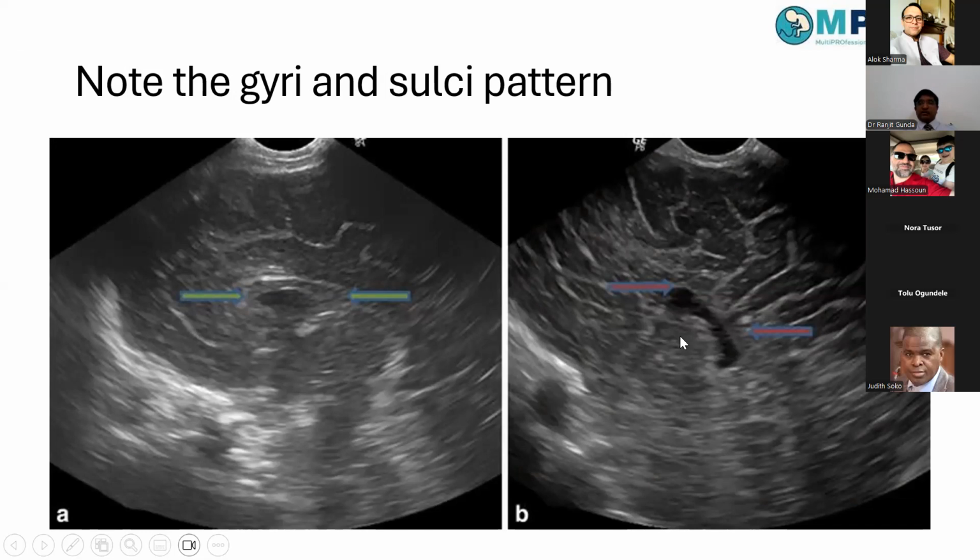But in the absence of the corpus callosum, we see this radiation of gyri. So this is another indicator that tells us that the corpus callosum is absent, not because of our technique. Again, if you have a chance at the end of the talk today, we can go back to Dr. Naushin's images and I will look into this in a bit more detail.